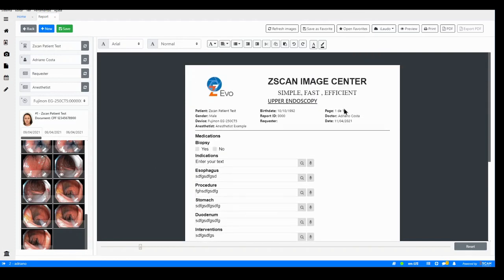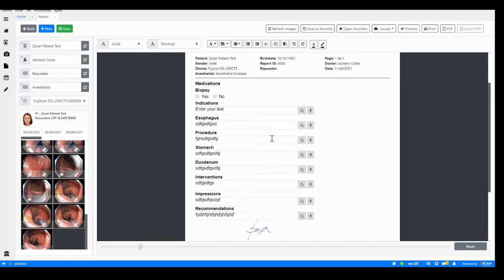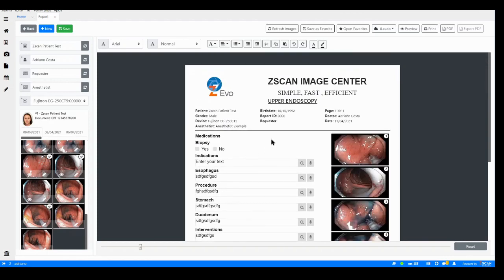So in this part that you're gonna use every day on a daily basis, you're gonna create your report. So all the changes, everything you're gonna do here, it's related to the content of your report, not the structure. Okay, you can choose your photos, add your text, and also create your favorites descriptions. So you're gonna add the descriptions.